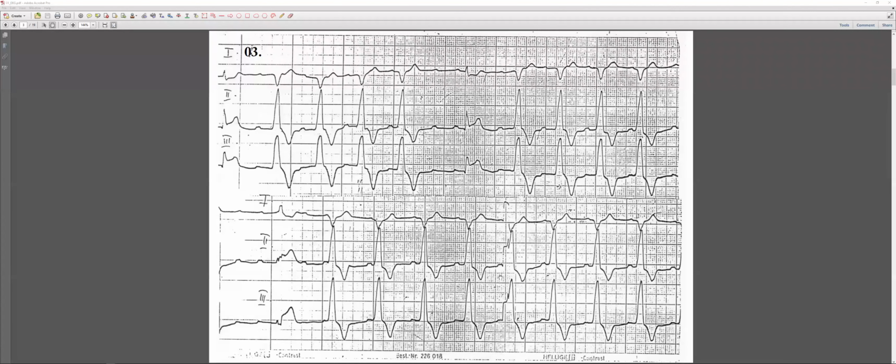Now, can I ask a question about the previous ECG? Yes, you can. Okay, I'm going to share it again. The fusion beat that you pointed out, as a general rule, fusion beats will always have different morphologies. The example you provided was very narrow, so I just wanted to confirm.